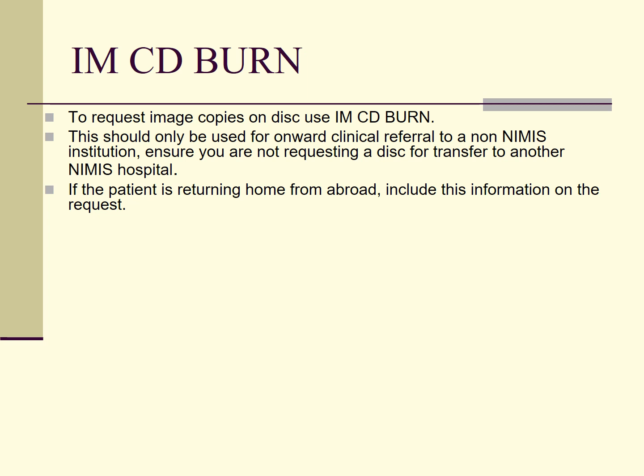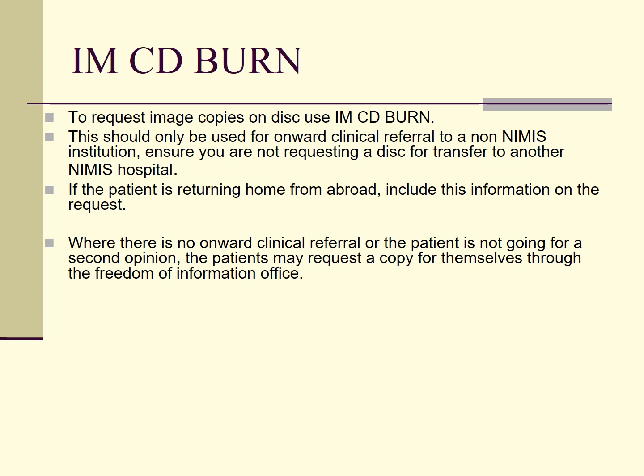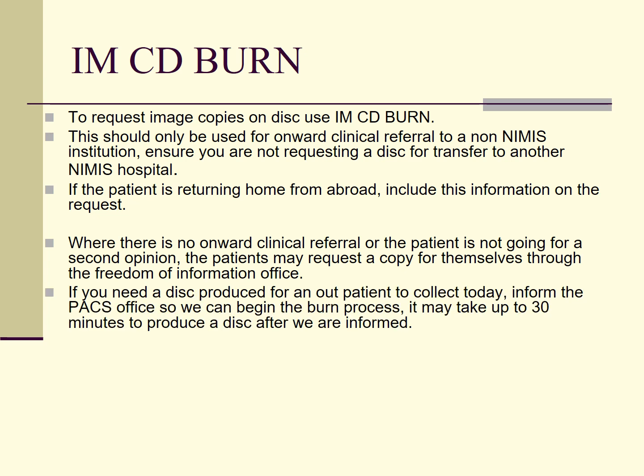To request image copies on disk, use IM CD burn. This should only be used for onward clinical referral to a non-NIMIS institution. Ensure you are not requesting a disk for transfer to another NIMIS hospital. If the patient is returning home from abroad, include this information on the request. Where there is no onward clinical referral or the patient is not going for a second opinion, the patient may request a copy for themselves through the Freedom of Information Office.